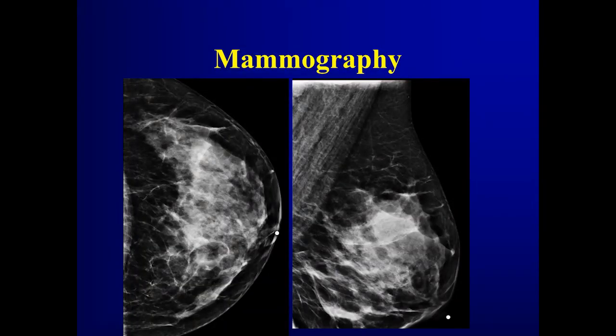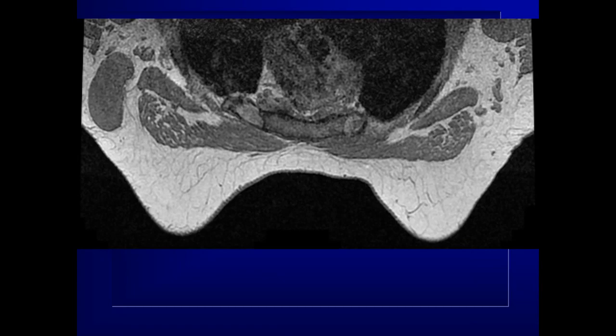So let's take a look here. A dense tissue, and we don't see particularly too much here. We see in the upper part of the image over the pectoralis muscle, we see what looks like a lymph node. When we go to the MRI, we can see that there really is marked lymphadenopathy there. So this patient was presenting with an unknown primary with axillary metastatic disease, and then the MRI was being performed to see if we could find a primary.